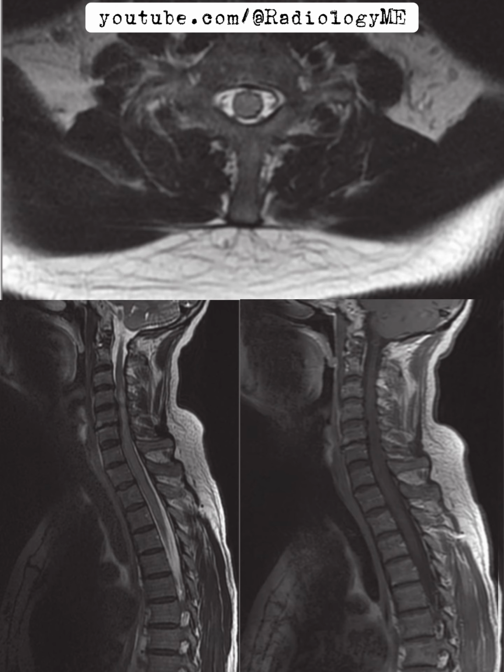When I piece together these findings, the sudden onset of neurological deficits, the appearance on MRI without significant contrast enhancement, I'm leaning towards a diagnosis of an acute spinal cord infarction. This also fits with the restricted diffusion seen on diffusion-weighted imaging, which was indeed evident when I reviewed the rest of the images from the scan.